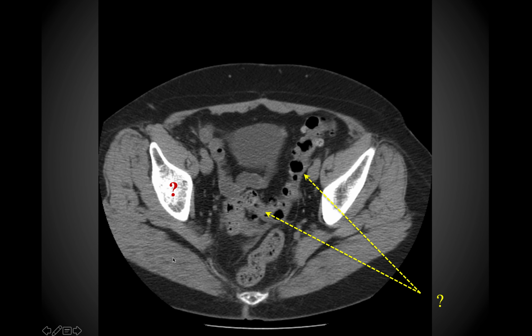So this is going to be found in the false pelvis. You want to remember that when we talk about pelvic imaging, you would certainly include this region in that designation. And so in this image, you can see the sigmoid colon as it's coming through and eventually becoming the rectum. And you'll notice that it has a number of diverticula in this example. And so you see some hyperintensity around those diverticula, which indicates that there's an inflammatory process likely going on there. So this person likely has a mild case of diverticulitis.